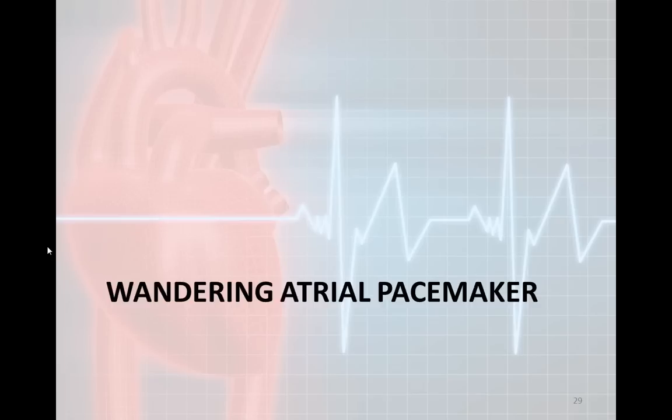This is the second part of the atrial rhythm interpretation presentation. Today we're going to cover the wandering atrial pacemaker, also multifocal atrial tachycardia and the difference between those, and we're also going to probably get into something I really don't like, which is SVT. We're going to talk about that a little bit. So let's go ahead and start off with the wandering atrial pacemaker.